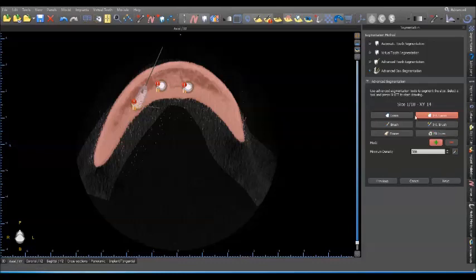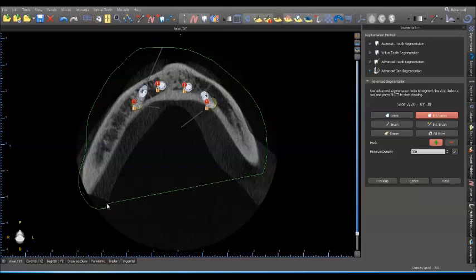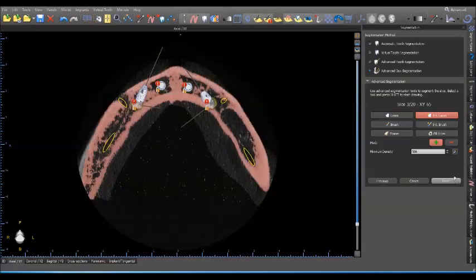It's going to ask me for 18 slices. I can actually just scroll here and pick up an extra slice or two if I wanted to be a little bit more precise, and continue to scroll through and get a bunch more images. So I'm going to keep doing this for a little bit until we run into a little issue. And you'll see, in fact, this will be the first one.